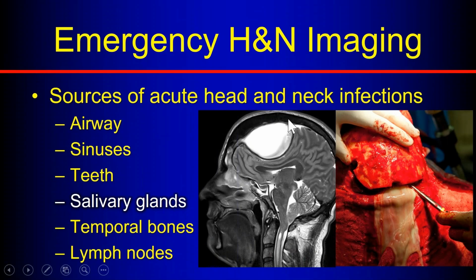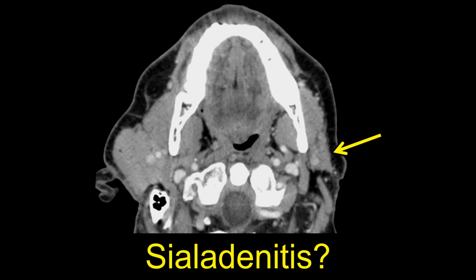So next we have salivary glands. These usually aren't acute in terms of patient clinical presentation, but they're often totally misdiagnosed or missed on imaging or thought of as something much more exciting than they really are. We like symmetry in neuro. So things that are symmetric and things that are midline are often hardest for us.